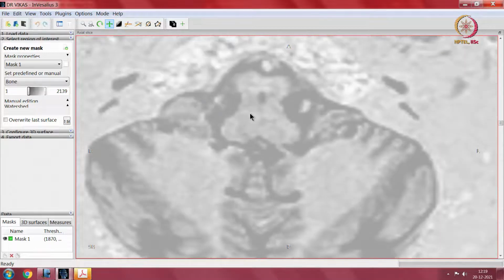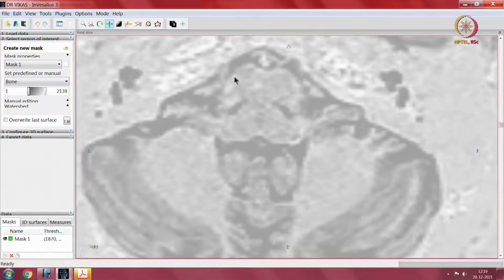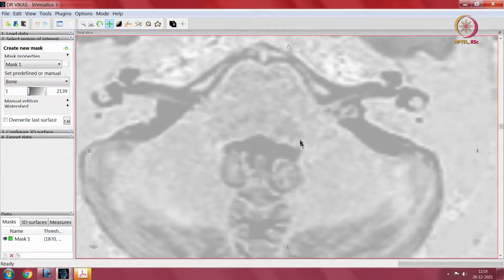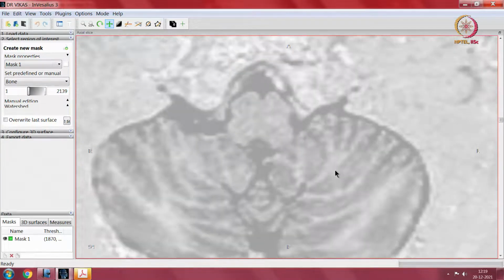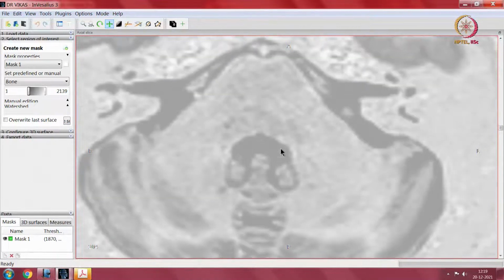Yeah, now you can see this transition. It is jumping and becoming bigger. So, this whole part would become the pons. This is the pons up to here. Pons is the place where there are connections with the cerebellum. If you go back, there are no distinct connections with the cerebellum here. You can see that there is a boundary here and then there is a clear boundary here. So, when it comes to the pons, it is obvious that the pons communicates with the cerebellum.